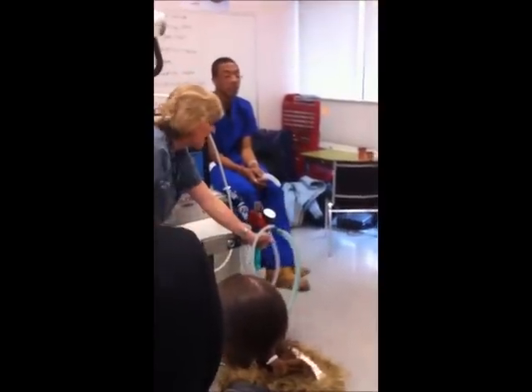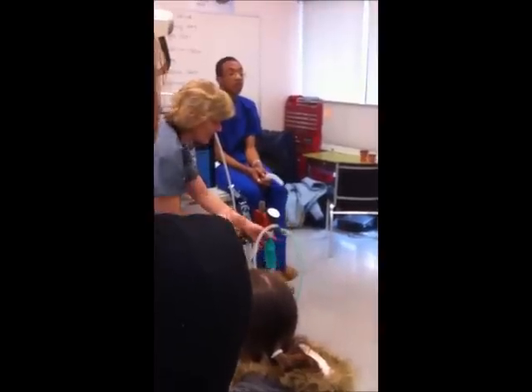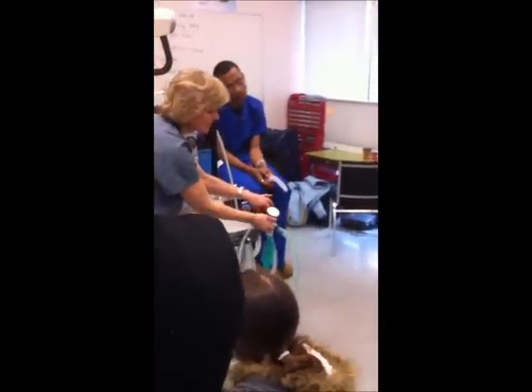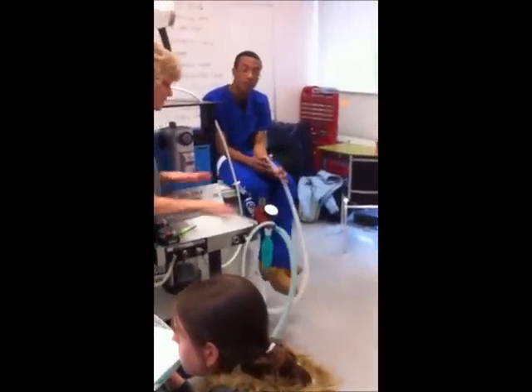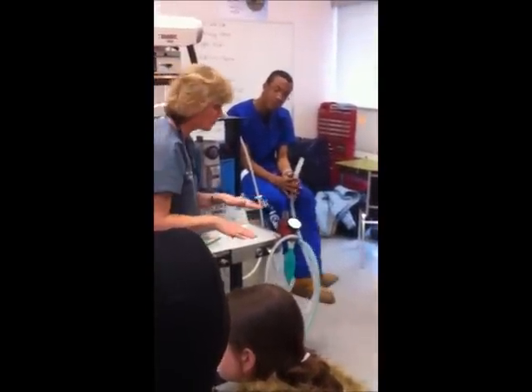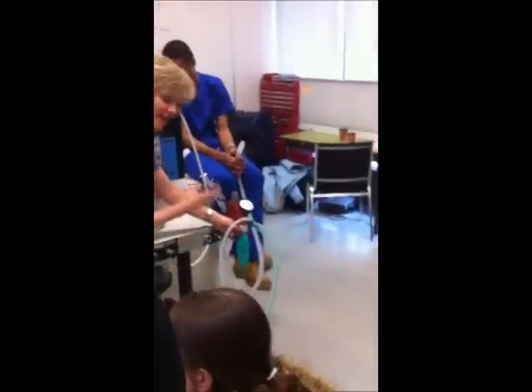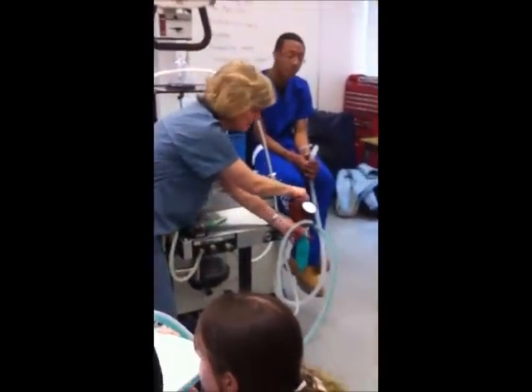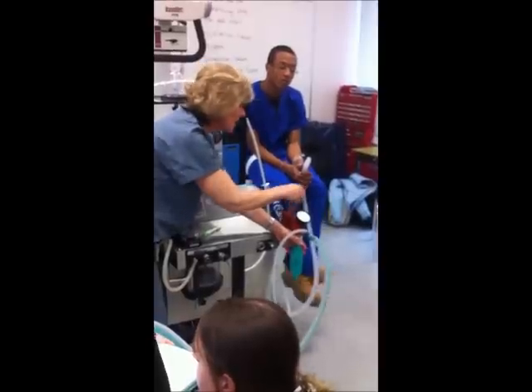Why do I have to open the bag almost immediately again? So it refills? Refills, because I squeeze in here. Now please understand that there's way, way, way more to anesthetic than what I teach you in the machine. It's much more complicated. This is a very good base to start with. But that fills back up with oxygen, so I can close it, squeeze, open. And that's the motion, okay?